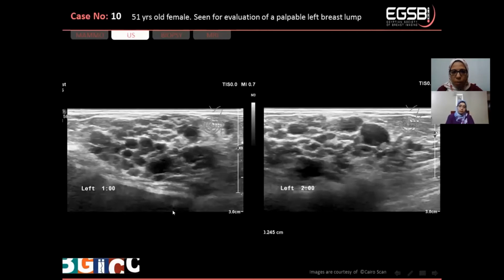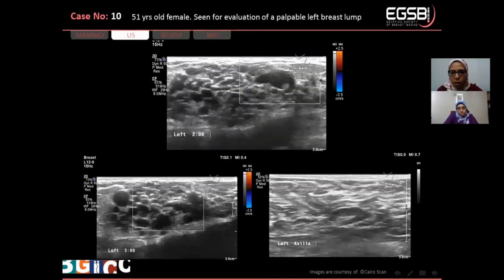When we performed a complementary ultrasound for this patient, we can see here a very condensed parenchyma of some cysts and dilated ducts, with some of the cysts showing a clustered tendency, and some are clear. Actually, we identified 2 cysts showing 2 small, tiny solid papillary nodules, like the one we measured here, and also the one we measured here.